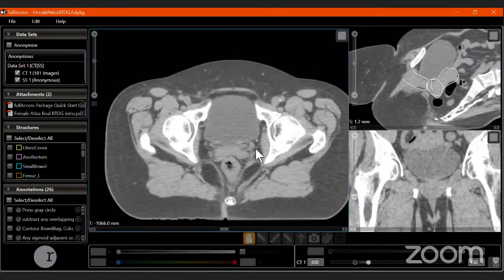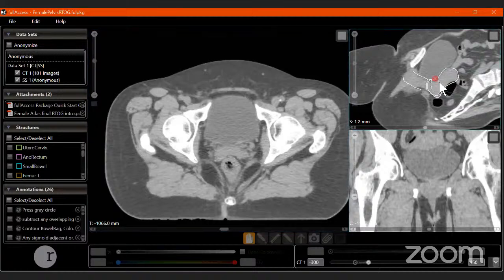So to identify parametrium, we are going to start from the uppermost part of the cervix to the lowermost part of the cervix. First we need to use different sections to identify what is a cervical region, what is a uterine body region, what is a vaginal region. I said the sagittal scan is quite useful in that. So we identify the body. This is of course a normal one, so it's very easy to identify here. But if it is a large growth, that growth is going to extend onto the vaginal space and it might also invade into the uterine space, or it can just uplift the entire uterine body above.